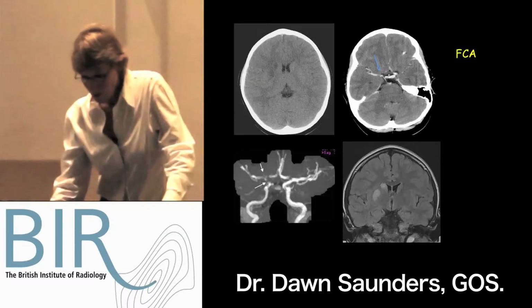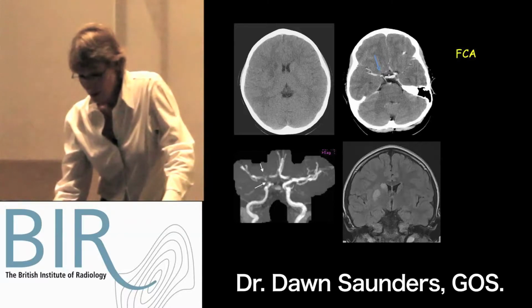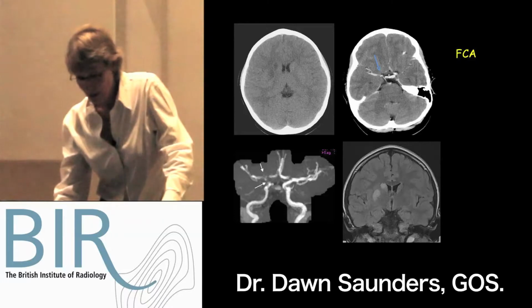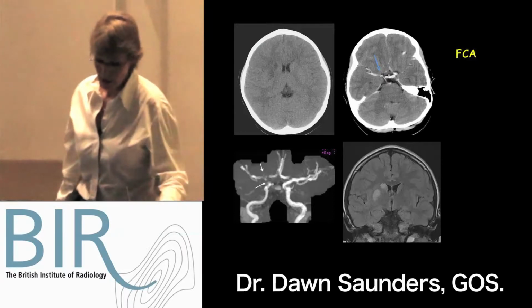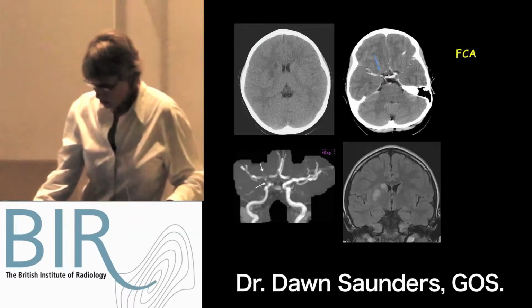And you can see that this child went on and, as required, had the MR, which confirmed the infarct, and an MR angiogram, which demonstrates that the arteriopathy is a bit more extensive, involving the terminal internal carotid, the M1 and the A1 segment on the right.